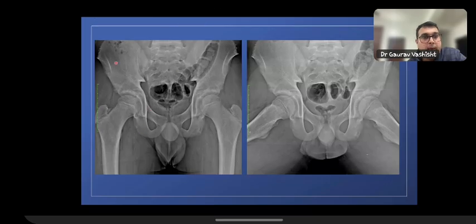Good. So as you go, always try to look at various apophyses. Apophyses are the areas where there is a tendinous attachment, the muscles attach to these bones, and these are soft bones in pediatric age groups. So with subtle injury, with mild injury, there is traction over these structures, and hence there can be bony avulsions.